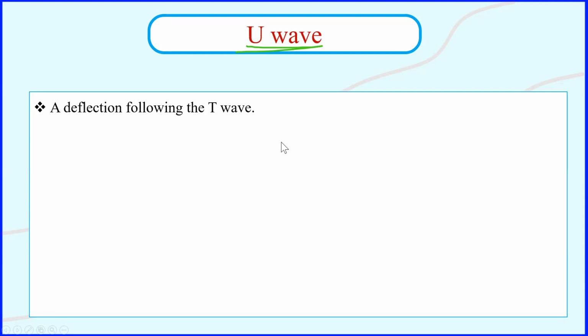Okay, so these are the EKG leads that are really great to assess U waves. Just remember that when we were assessing the P wave, we were looking at lead 2. So the P wave is different from the U wave. Now, what is the source of the U wave? Actually, the source of the U wave is really unknown.